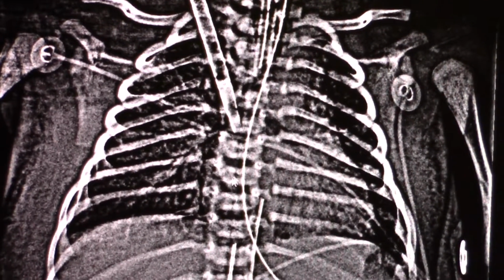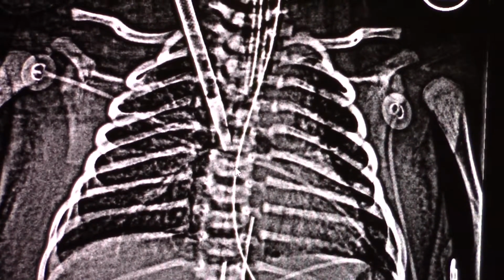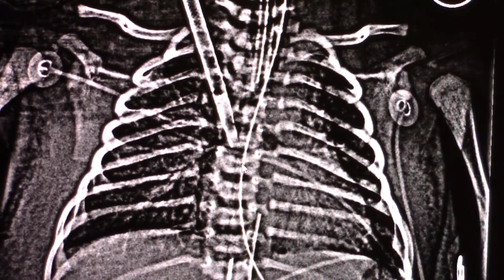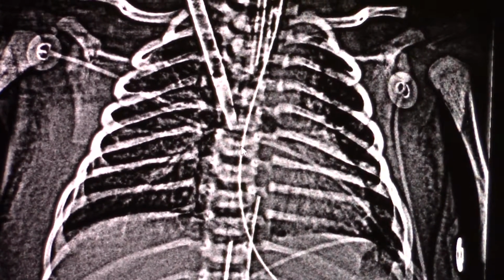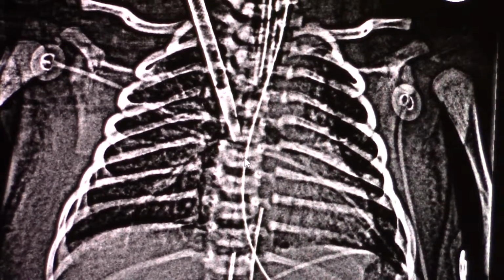So we're going to use a thoracic vertebra because they're a ball structure. So when you rotate, if they shoot it where it's not at 90 degrees, the ball just rotates on the same axis and it stays in the same spot. So it doesn't change the image of where the tube is in relation to the chest for that reason.